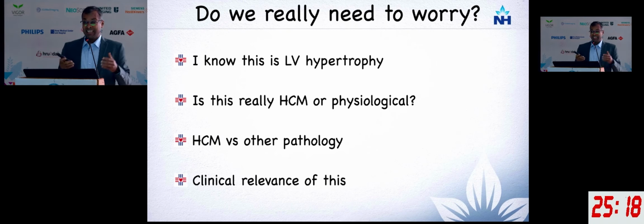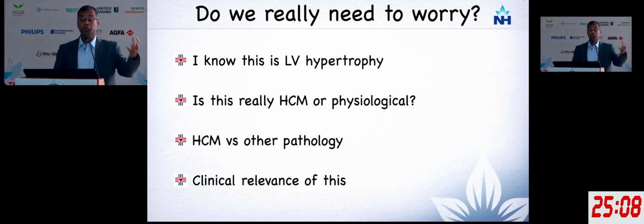So, do we really need to worry? Yes. Every time you look at a cardiac MR, the first and foremost thing I train my fellows to do is to look for LV hypertrophy. Because if you know that this is LV hypertrophy, the next question you have to answer is, is it hypertrophic cardiomyopathy or is it physiological? Then you have to say, fine, this is not physiological, this is not HCM, but what is the other pathology that you're looking at? And at the end, what is the clinical relevance?